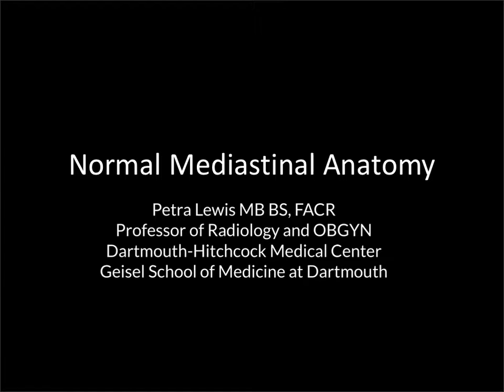Hello, this video is my attempt to make a recording of what is an interactive session with the medical students looking at the anatomy on chest x-rays of the mediastinum. This session normally involves the students drawing on images on my iPad and projecting to the screen, so forgive me if parts of it don't translate terribly well.